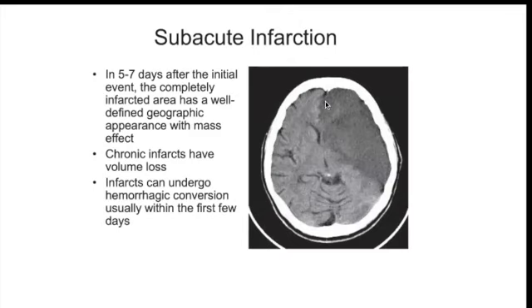So by the word mass effect, what do I mean by that when I say that the patient has a mass effect? How should that appear on a CT image? When I say mass effect, what should you be looking at on a CT image? Midline is shifted. Perfect. So when I say mass effect, I'm looking at the midline, and here the midline is sort of shifted because of the mass effect. Perfect, okay.